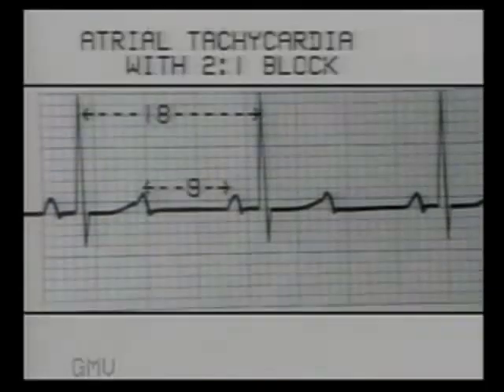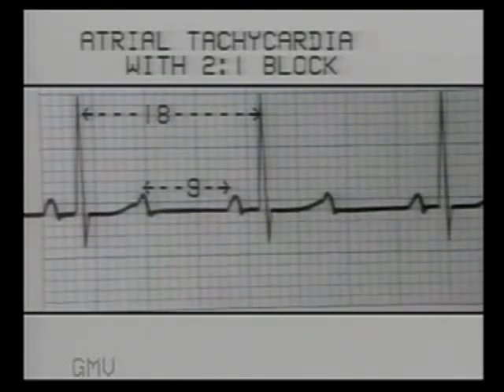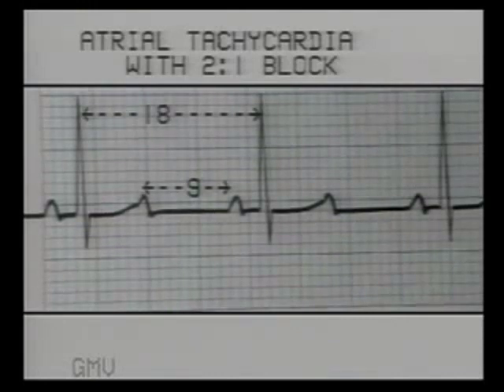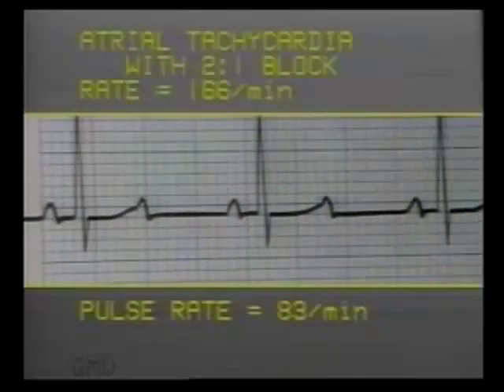In this case, we must count the atrial rate separately as 1500 divided by the number of small squares between two P waves, and ventricular rate separately as 1500 divided by the number of small squares between two R waves. The atrial rate here is 166 per minute, indicating supraventricular tachycardia, and ventricular rate is 83 per minute, indicating 2-to-1 block.